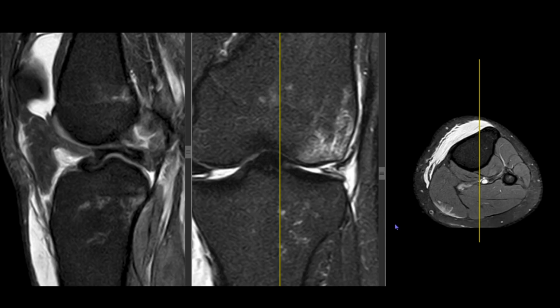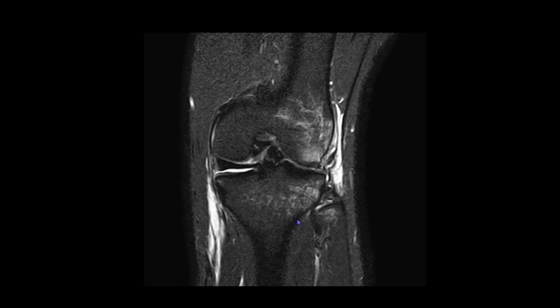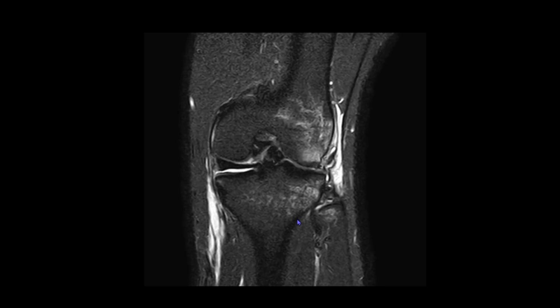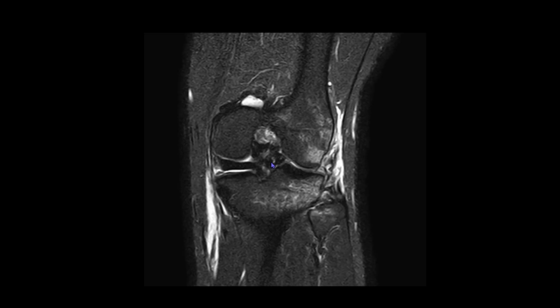Now coming on to the medial and the lateral collateral ligaments, on the medial aspect we clearly see there is widening of the joint space. This can occur only when there is loss of constraint on the medial aspect. The medial collateral ligament should run from the femoral aspect onto the proximal tibia. Here we are able to see the intact hypointense femoral attachment of the medial collateral ligament.